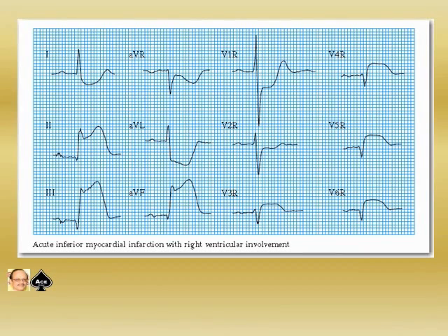This picture shows acute inferior myocardial infarction with the right ventricular involvement. Another example of acute inferior myocardial infarction with the right ventricular involvement. So this picture also needs you to memorize the picture.